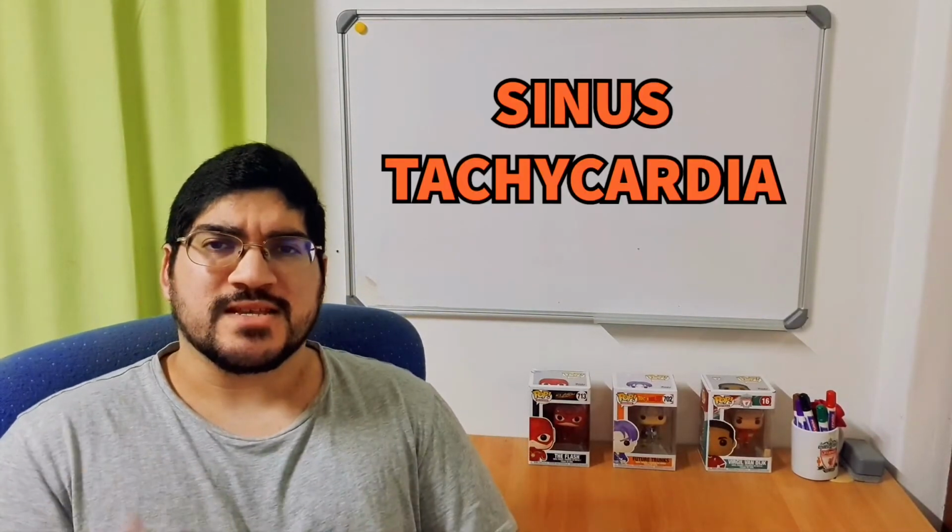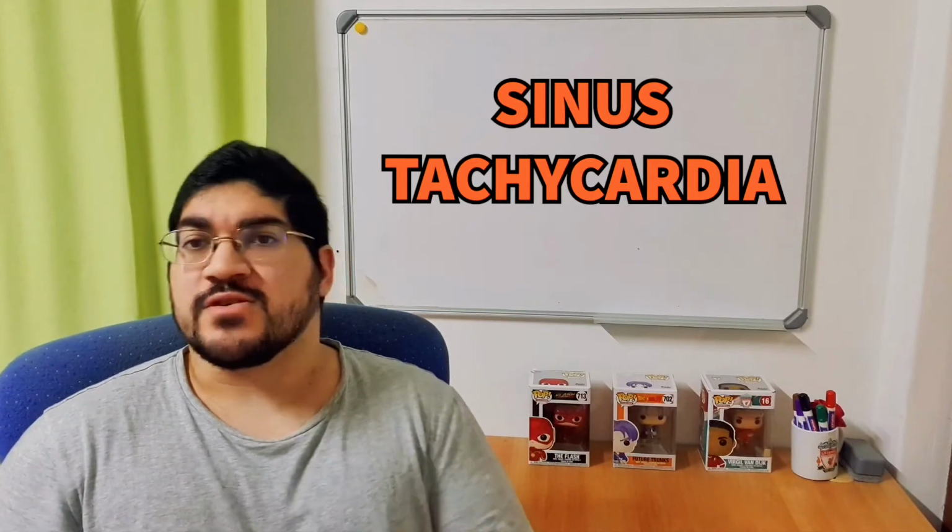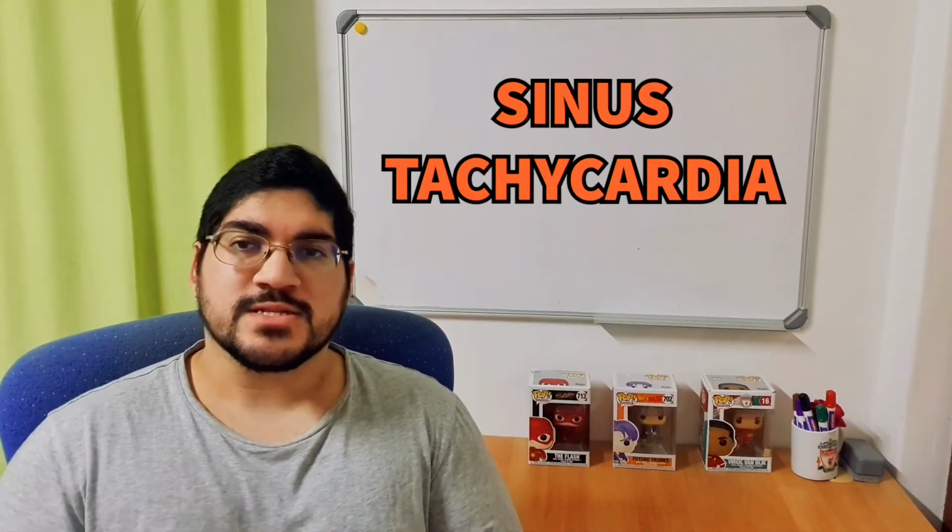So what are the tachycardias where you have a regular rhythm and a supraventricular tachycardia? And the first one, and the most obvious one, is sinus tachycardia. So sinus tachycardia is just, you've been out, you got a fright, you were running or something like that, and your heart starts beating a little bit faster, right? So as soon as that heart rate goes over 100, that's called a sinus tachycardia, because the sinoatrial node is still releasing impulses, but it's just doing it faster to meet an increased demand for oxygen. Now sinus tachycardia usually tops out around 160 beats per minute. If you see a tachycardia around 200, 210, that's very unlikely to be a sinus tachycardia.